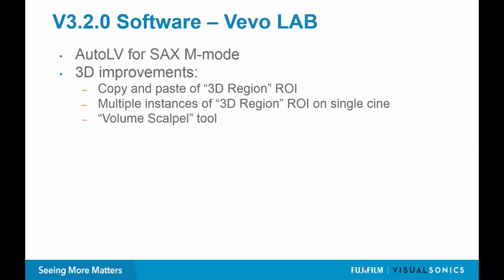There are multiple areas of 3D improvements. A lot of these tools are useful across 3D acquisitions in all different modes, but I think they have a lot of utility in photoacoustics. Yeah, and I don't want to go into too much detail here because we'll actually be demonstrating them. But these are significant improvements in the ability to do 3D measurements, multiple 3D measurements, and copying and pasting those measurements. And the same with the oxyhemo tools as well. Yeah, I'll show that. Okay, great.